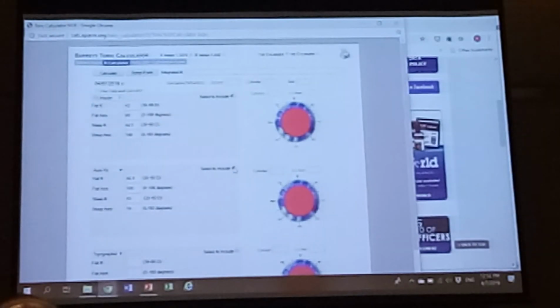The computer needs to know that you want to use this data, and this is useful later on if you want to just compare, say, two sets of keratometer. You can deselect this box.